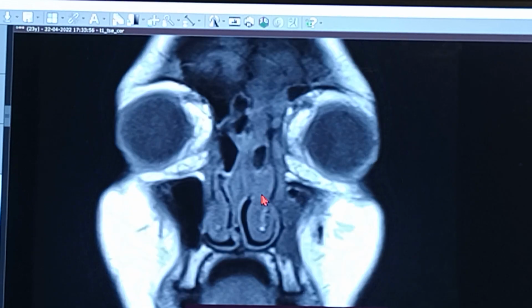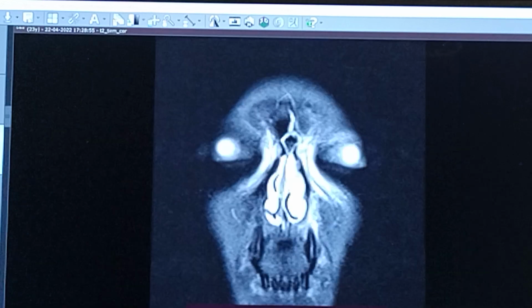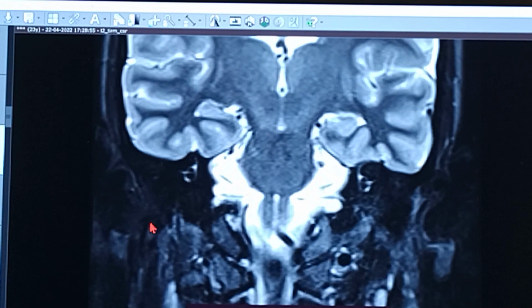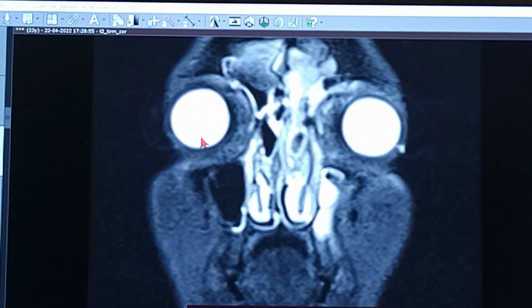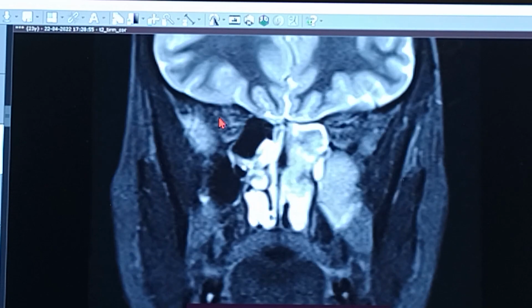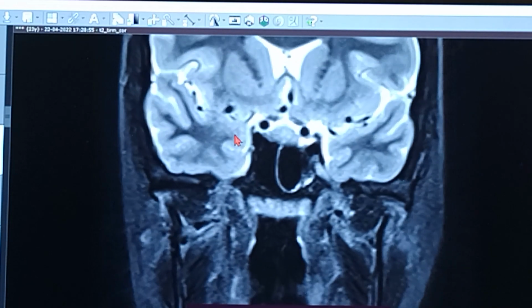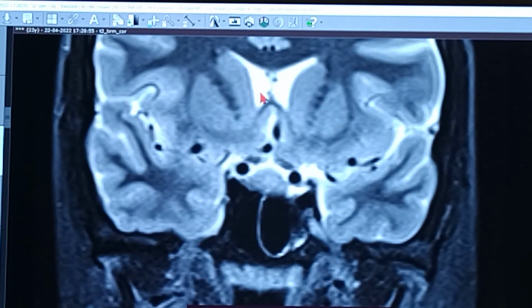So this was the coronal T1 scan. Moving further ahead would be the T2 coronal scan. Now, the same coronal scan I'll be showing you for the T2 scan, going from the anterior to the posterior part. Now this is T2. Look for the orbit. You can see bright white, that has to be T2. Now look for the brain, and in the brain look for the ventricle, which is somewhere over here. Yeah. So as you can see, if I zoom this, that's the ventricle, severely bright white.